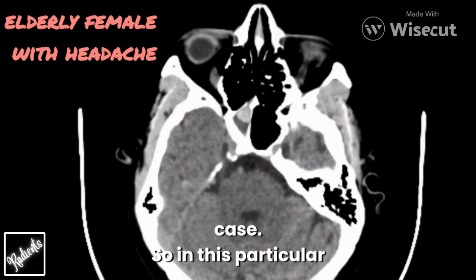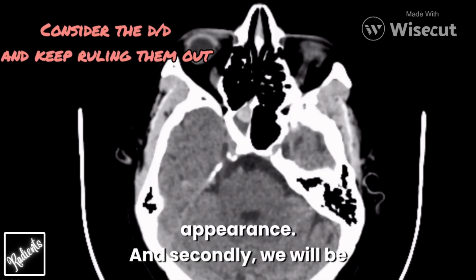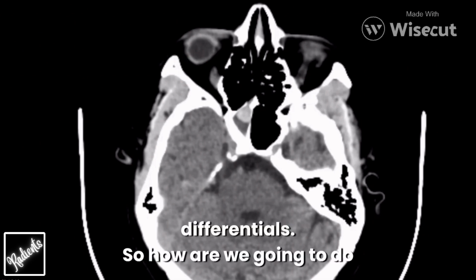So this was the case that we had given, and what you see on your screen is the NCCT image of that particular case. So in this particular video, we are going to discuss in detail what are the differential diagnoses of this appearance, and secondly, we will be discussing how to differentiate or how to rule out the different differentials.